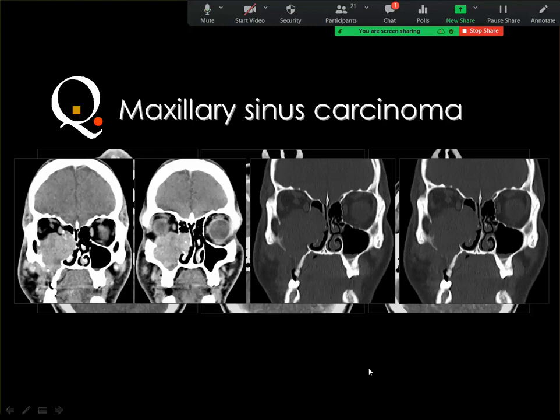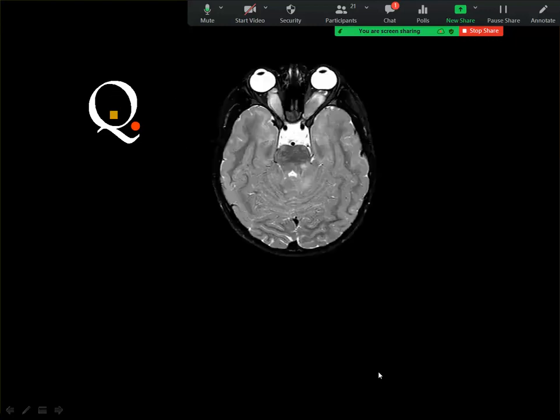The case. Someone will say to you that lymphoma does not cause significant bone destruction. This is right, and lymphoma may creep between tissues without significant destructive changes, but this is not the rule. You may get lymphoma that can destroy the bones like this one because after all, lymphoma is a malignant lesion.